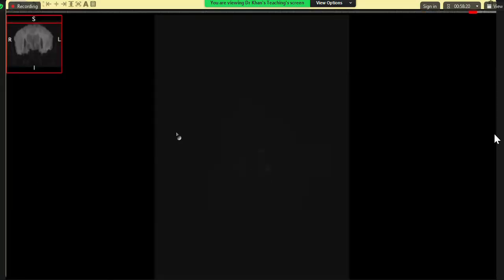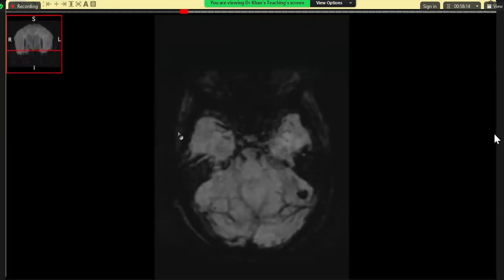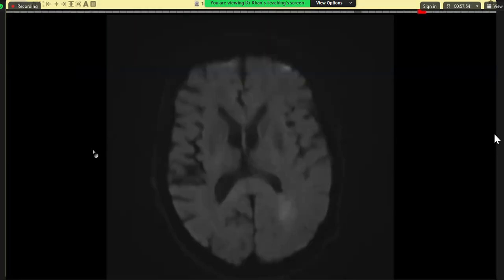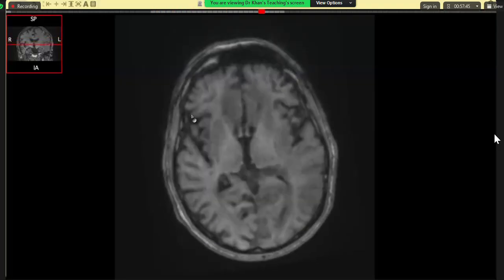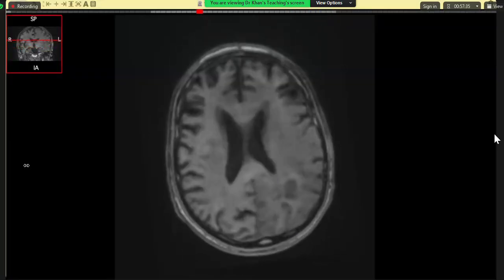But one thing, candidate three, when you ask for post contrast, you must look for a pre contrast before you look for a post contrast. In this case, there was a hemorrhage. Of course, you could have asked for this, but the key thing is always ask for a T1 pre. When you ask post contrast, then tell the examiner that I also want to see the pre-contrast so that if it is relevant, he or she might show you. So in this case, if you see here, there was a bit of hemorrhage. Hemorrhage is also taken as a sign of highly malignant lesion.